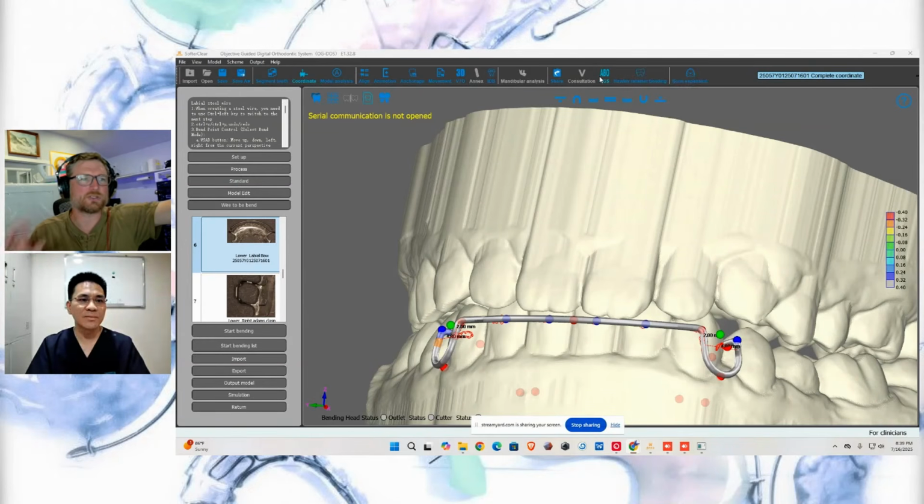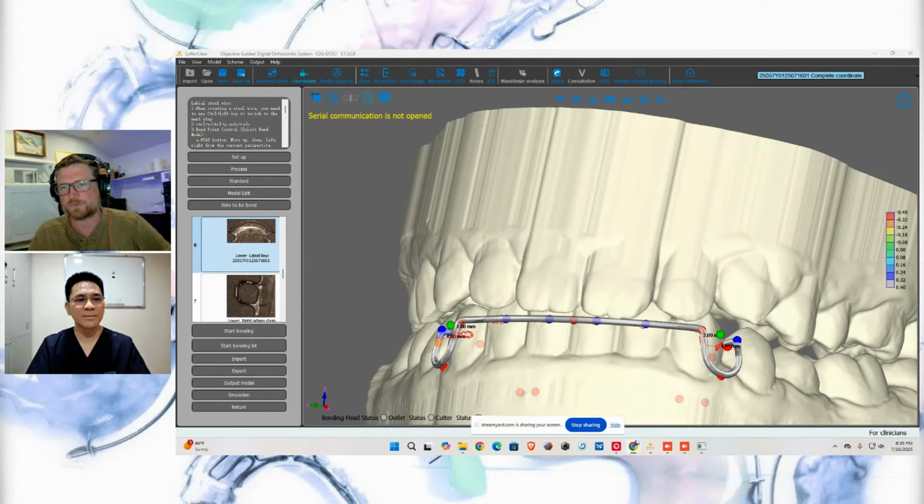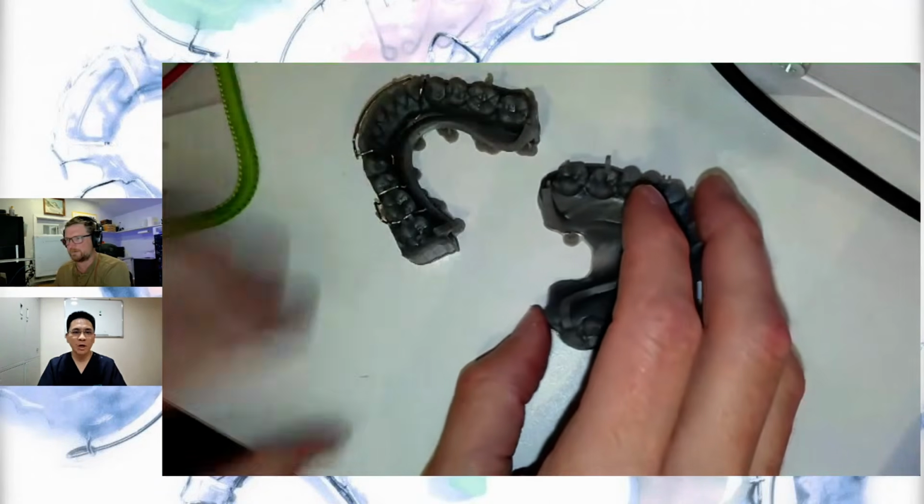Wow. See, there's so much in here that me as a lab owner would not use. Maybe the bone expansion, but of course the wire bending and the model editing and stuff like that. And I saw on there also twin blocks, and that might be another video, as making the things for this. Yes, later we will talk about the digital twin block.